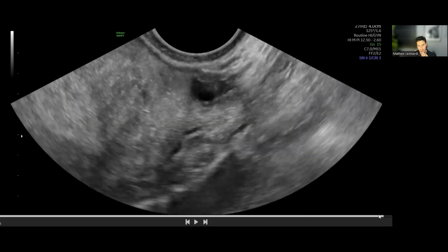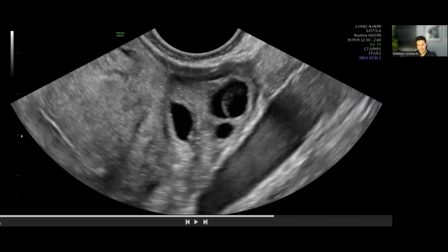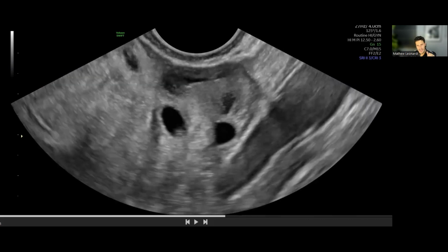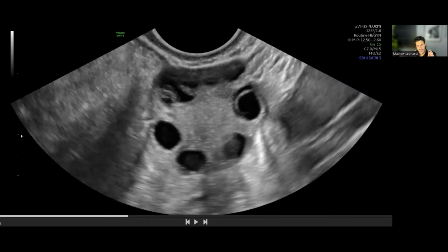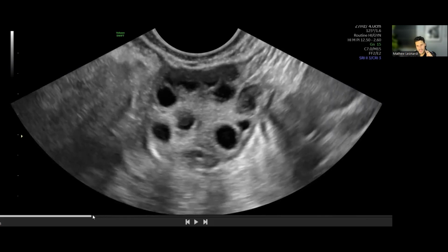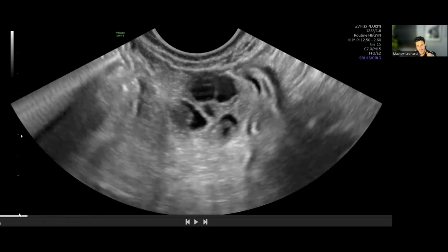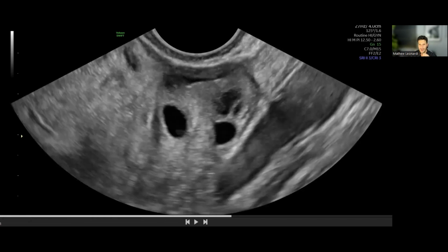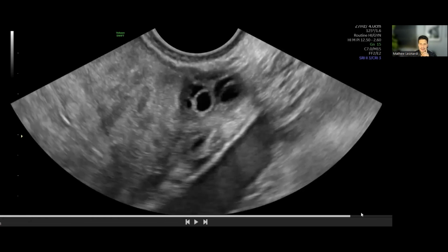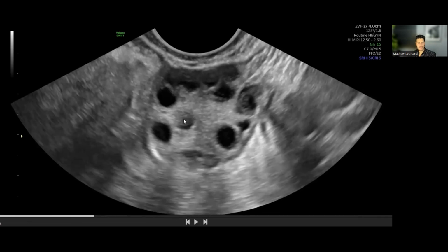So 1, 2, 3, 4, 5, 6, 7, 8. We're not counting that one. 8, 9, 10, 11, 12, 13, 14, 15, 16, 17, 18, 19, 20, 21, 22, 23. So I'm getting 23. I don't know what all of you got at home. Maybe you counted along with me. I'm getting 23. So I would certainly consider this to be a polycystic ovarian morphology.